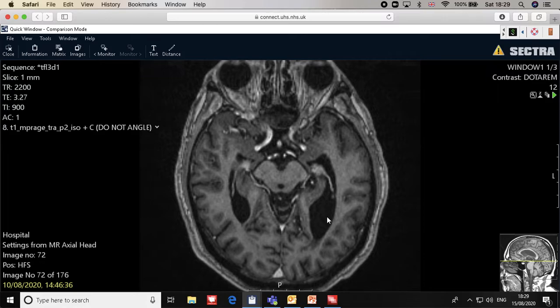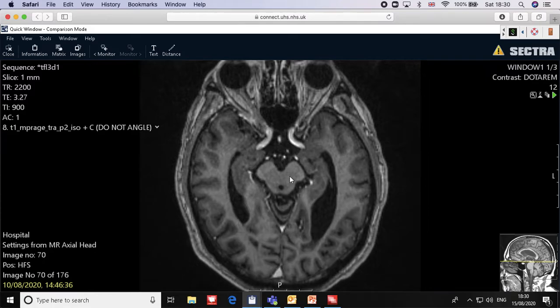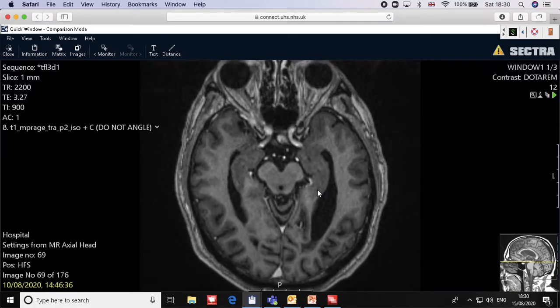How did I know that this is a T1? Because the CSF is a signal void or black. If it were white, this would be T2. You don't have to go through that, please refer back to my lecture. You can see here it's with C. C means there is a contrast injected, and you can see easily it is inside the vessels, and it's very, very obvious. Now let's see the chiasm.